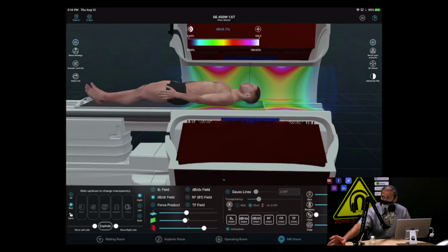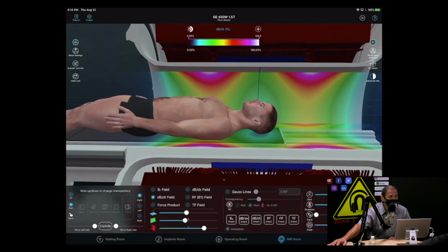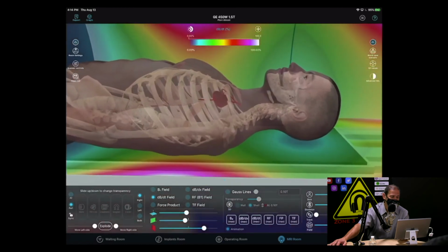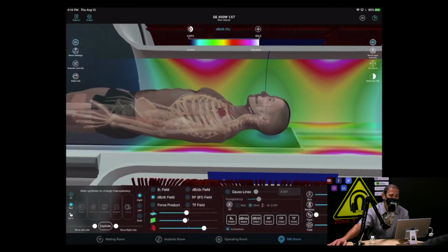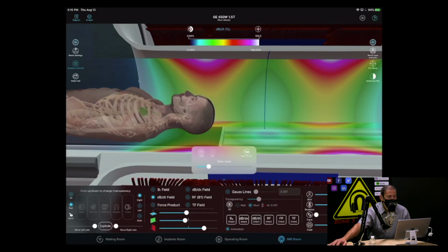So this shows that if this guy has a pacemaker, which, as in a moment I'll show you he does, you're scanning the brain, and where is the greatest red? Right over his chest. Yeah. Let me make that patient's skin invisible. Now can you see that red pacemaker? Yeah. Almost exactly under where the gradients are maxing out. So if the patient would be further away, then the pacemaker can turn green again.